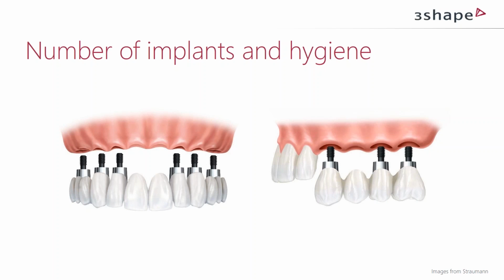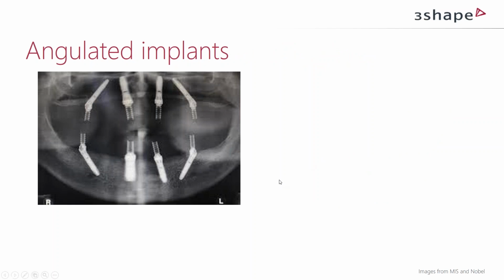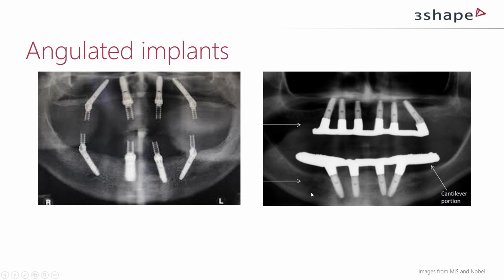That makes sense. We talked a little bit about angulated implants, and we can see that of course these can cover and take the forces in some way, but an angle with the forces coming from the top actually gives stress to one of the sides of the implants. It's just easy and simple biomechanics. So when we look, for example here, trying to place the implants where it's possible, because without the guide and planning, you don't dare to go close to the nerve, so you stay safe. You place everything between the foramina, and instead of that, you actually place a long cantilever.